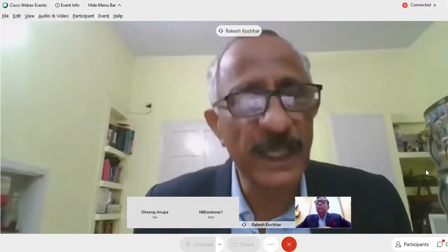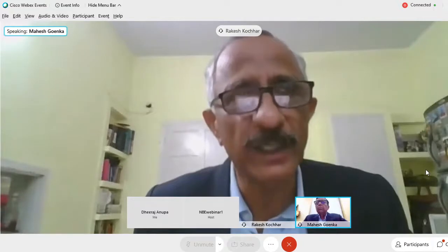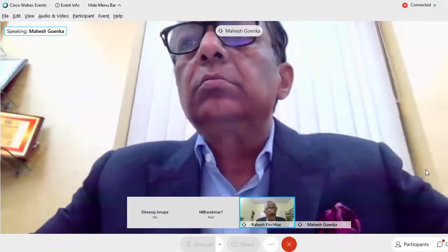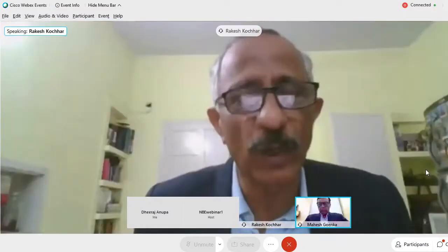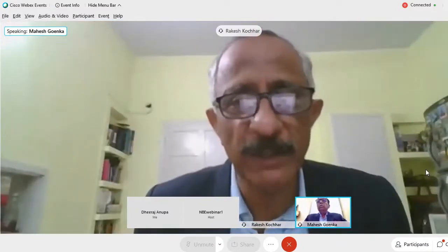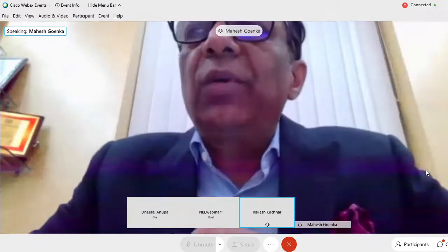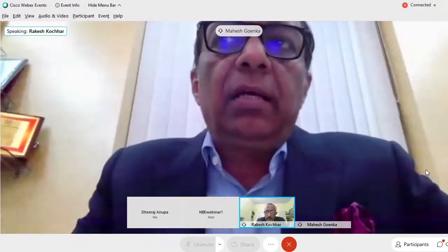But in patients where the Z line is not clear, you just look at the gastric folds. Where do they go and where do they end? So that will be the squamocolumnar junction. Ultimately, it is the same thing. To clarify for the students once again, we are looking at three landmarks.